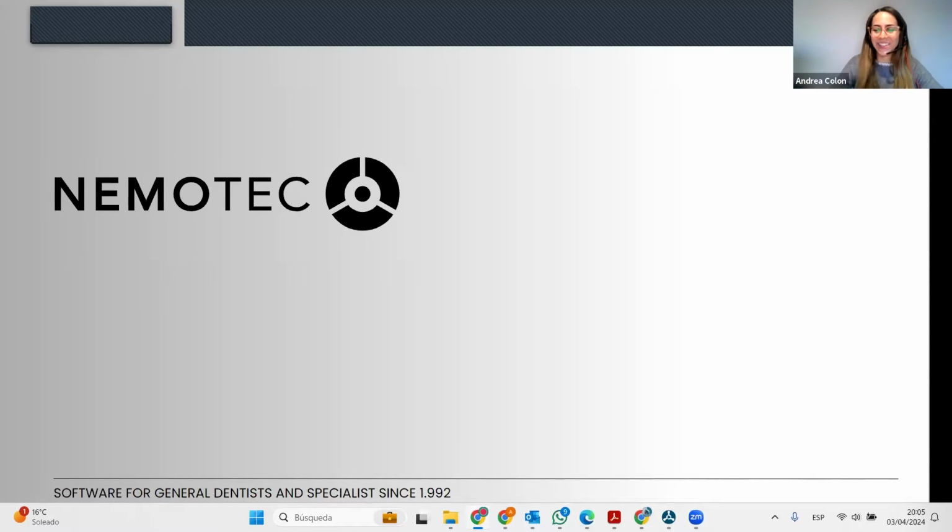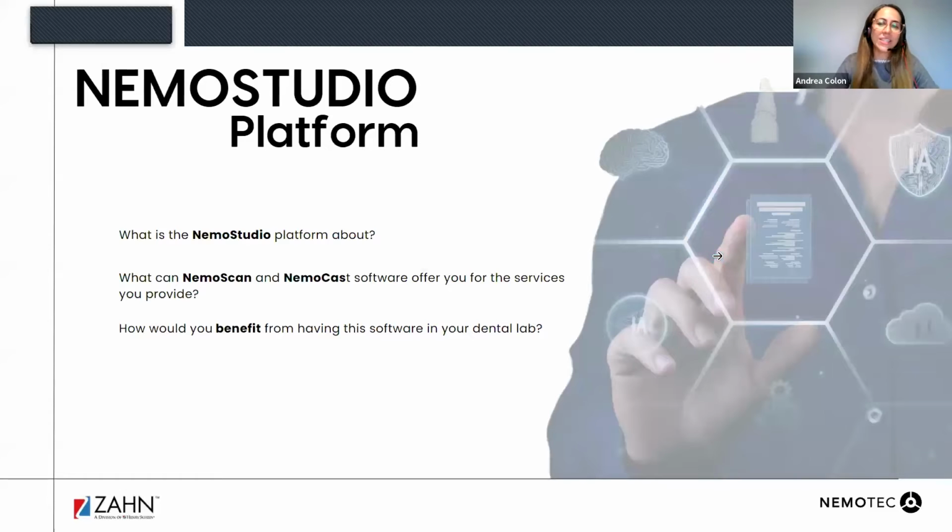Okay, great. Let's start. Today, I'm going to share with you what the Nemo Studio platform from Nemotec is and why it is going to be very interesting for you.